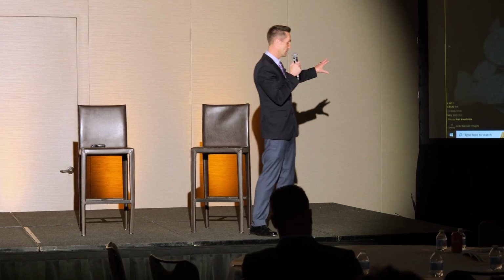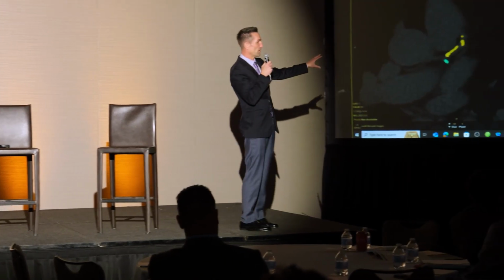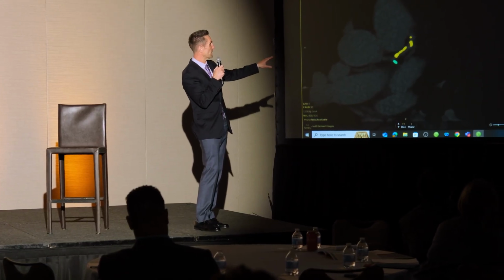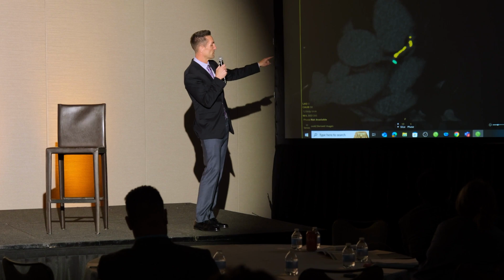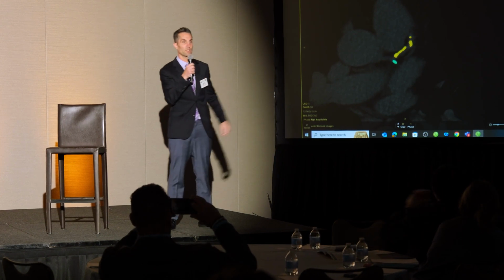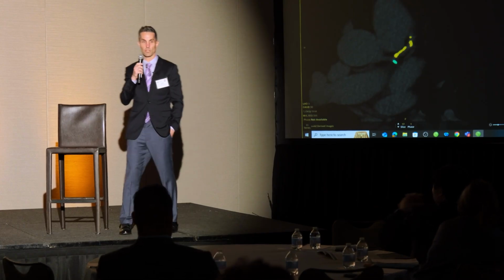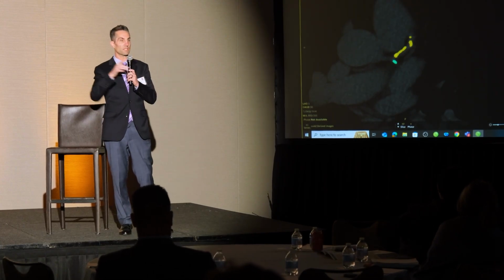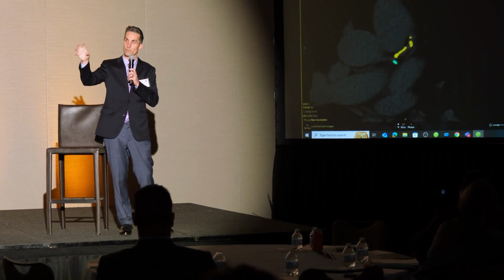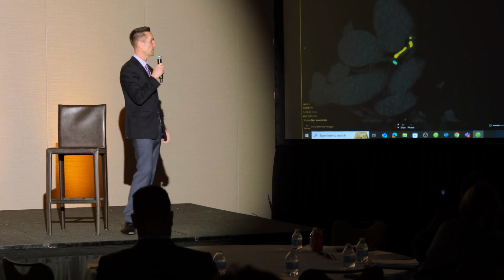So this is all automatically regionalized, and the areas of interest are already automatically placed into whether the calcium is in the LAD, the left circumflex, the RCA, whereas with most others you'll have to go in, whether they call it lassoing or going around the area of interest, and actually set the computer to the area you're interested in, where it's the LAD, and that's what you want quantified.